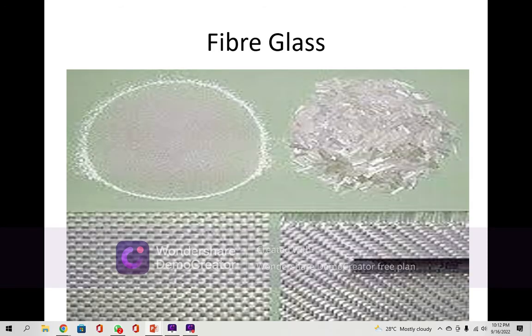It may be just like fiberglass. You've seen the fiberglass? It is a translucent type of glass actually used in windows, etc. You cannot see outside, only the light can come, but it is a blurred vision. Again, there are small patches seen here. No network. Fiberglass appearance.